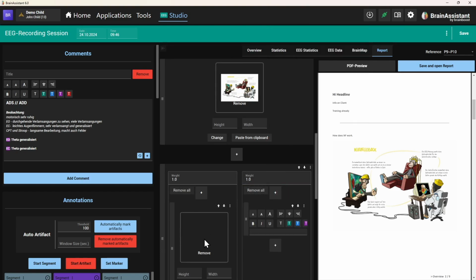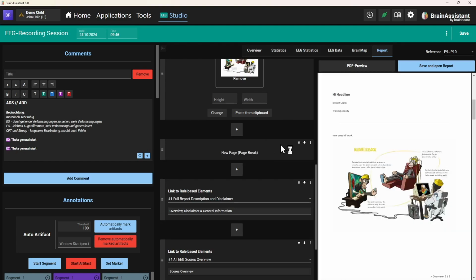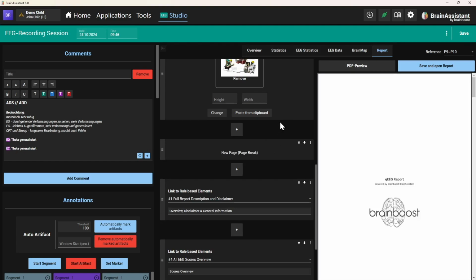text here. So on the left side, you can have a display of a certain image that you created somewhere, or you screenshotted somewhere, and then describe it on the right side, right? So you can imagine it looks also pretty nice and pretty structured. If you don't want it, press remove. Also very important, of course, I'm going to show you a few more things. Also very important, never forget to press save.